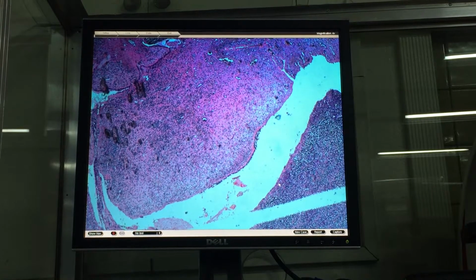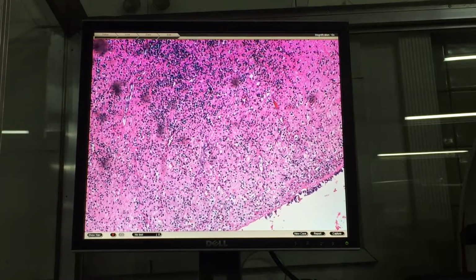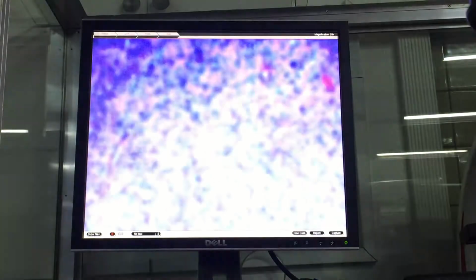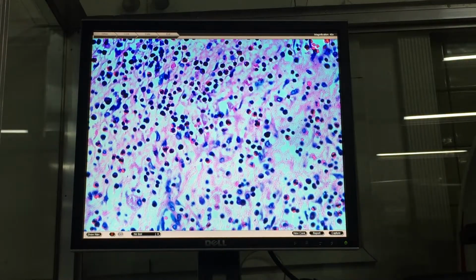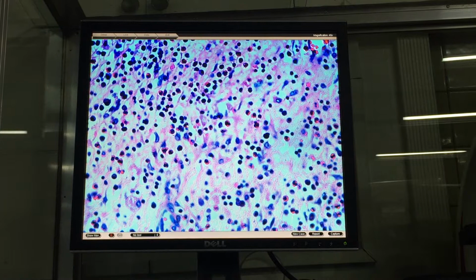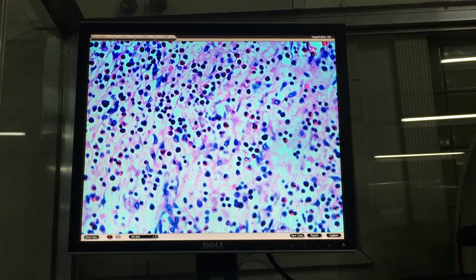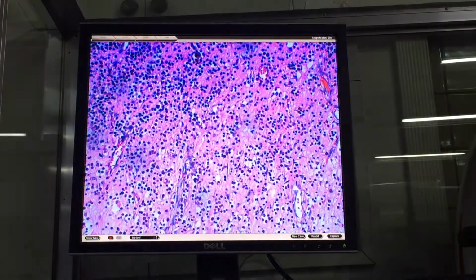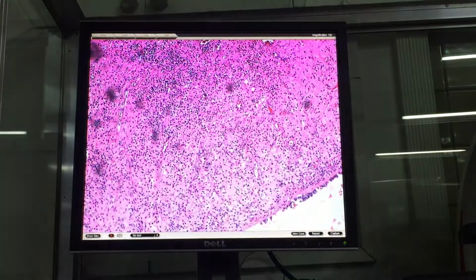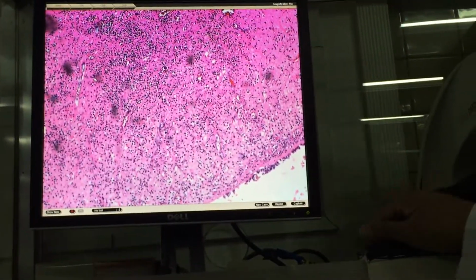As I've said, inflammation varies in amount. Here, there's a moderate amount of inflammation. And the inflammatory cells you see here: eosinophils, lymphocytes, plasma cells. And again at low magnification, see blood vessels, congested blood vessels. That is your inflammatory nasal polyp.